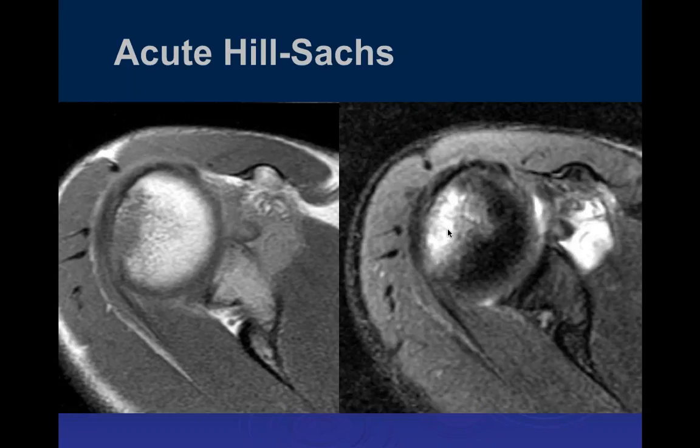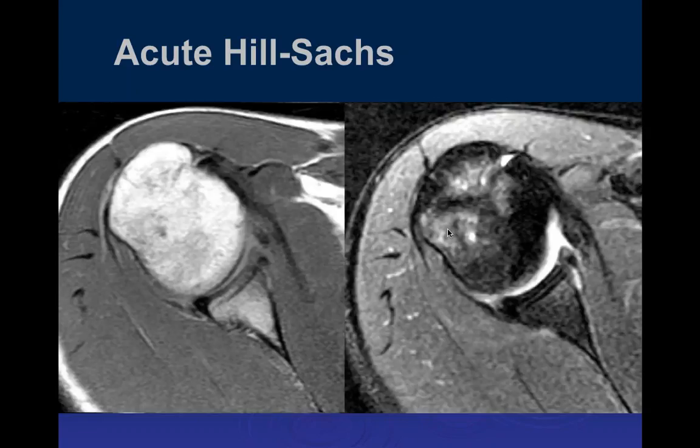So obviously the next thing you have to look at is the anterior labrum. And here, if we come down here, we can see that there is abnormality here. There's some edema within the anterior inferior glenoid, but we know that typically when you have the anterior dislocations, you will commonly get traumatic injury to the bone here. You may get a fracture, or you may just get trabecular bone injury. In this particular case, we also said the other thing you could do is shear off the labrum, and this is a nice labral tear.